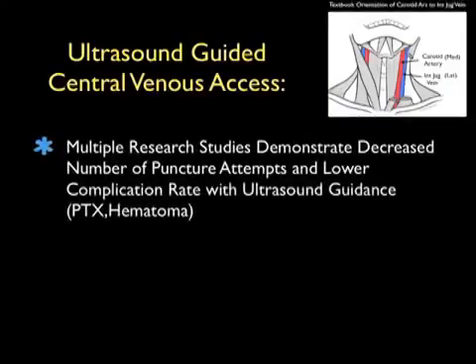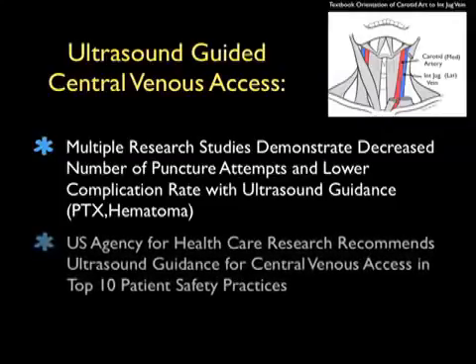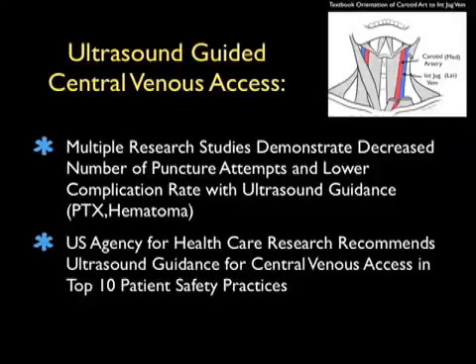Today's module is going to look at the use of bedside ultrasound for placement of central venous catheters, specifically the internal jugular vein in the neck. So the question is, why use ultrasound for central venous access, and why not just use the traditional landmark technique?